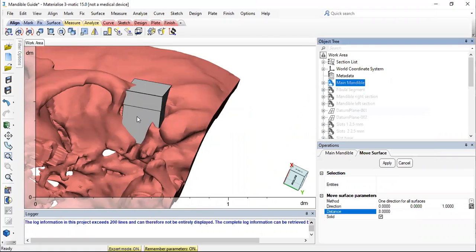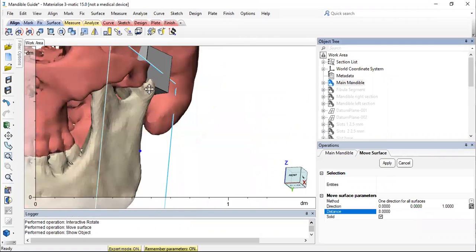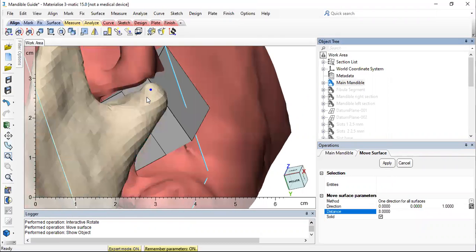So it's a little external, but let's assume अगर आपने कोई spherical condyle बनाया रहेगा जो डिजाइन किया रहेगा and it fits in the central cavity, so you have to subtract both the bone and the condyle or the PSI that you will be creating, ताकि आपके दोनों साइड के condyle fixation हो जाए. And जब आप anatomy को subtract करोगे तो ये anatomy को अच्छे से ले लेगा.